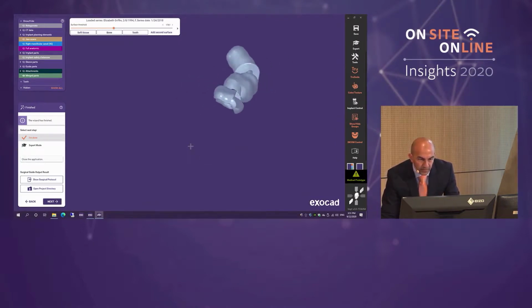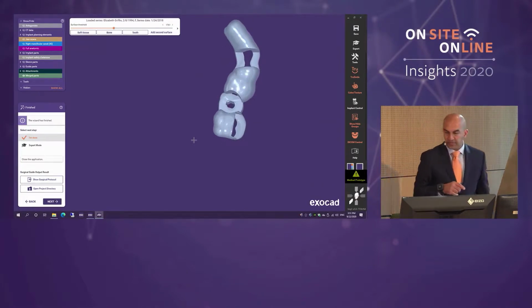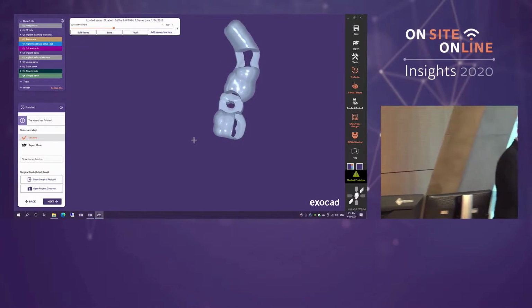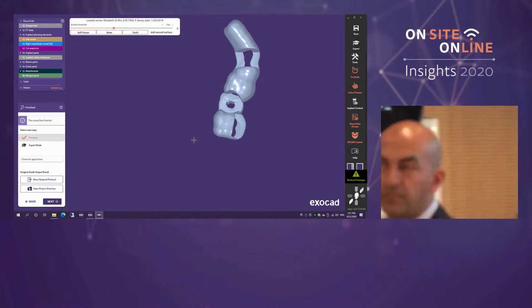And we already have this design on the printer, so I'm going to go ahead and go to the printer and fire that up so that we start printing live, and then I'm happy to take questions from any of you.